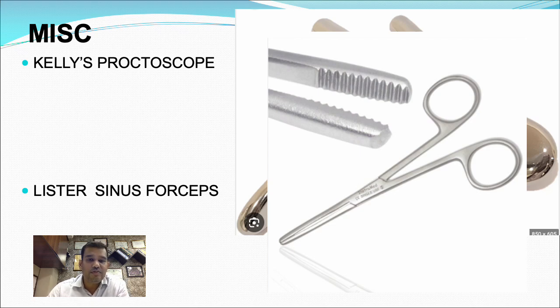In areas where you have a neurovascular bundle, as in your neck, your axillas, and your groin, where you have a lot of neurovascular bundle and there is an abscess. If you give an incision and your blade reaches this, it may traumatize or cut the artery, vein, or nerve, whichever structure is nearby.